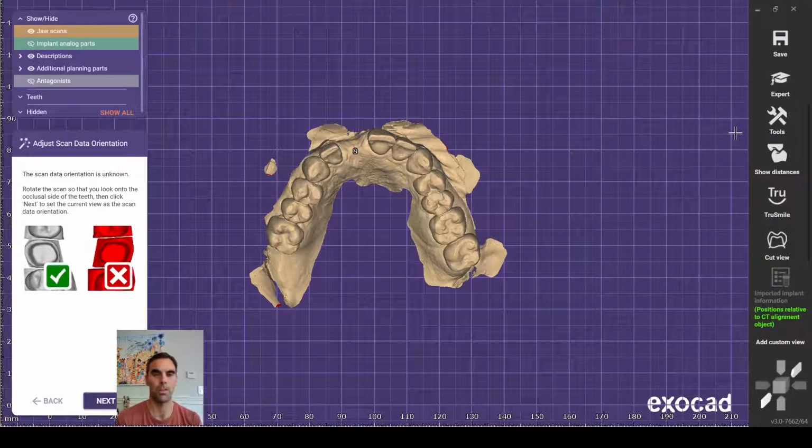It's basically focused on tooth mirroring and developing that emergence that's going to help heal and restore the soft tissue architecture of a site. So let's get into it.